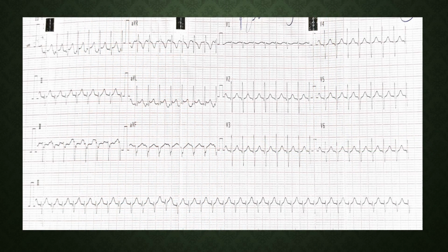Okay, this is an ECG of a 25 years old male who presented to emergency with complaints of palpitations for the few hours. This ECG was taken during the episode of palpitations. Now let's decipher this ECG.